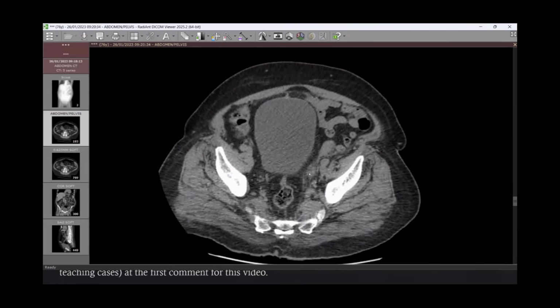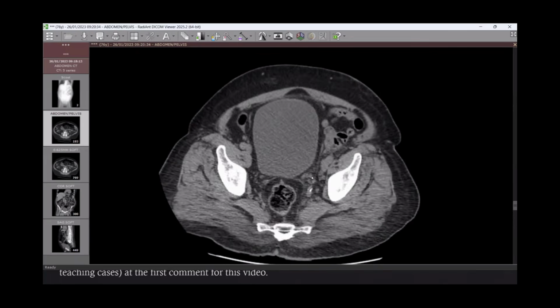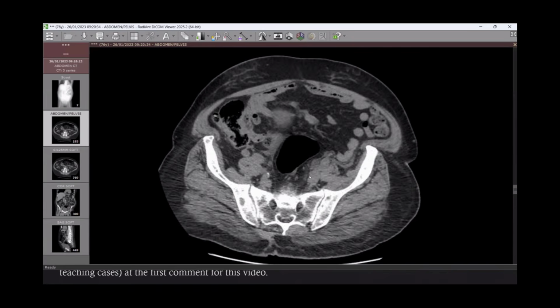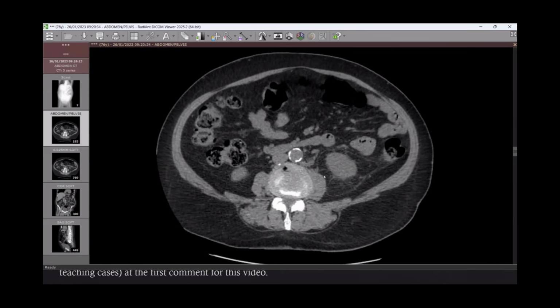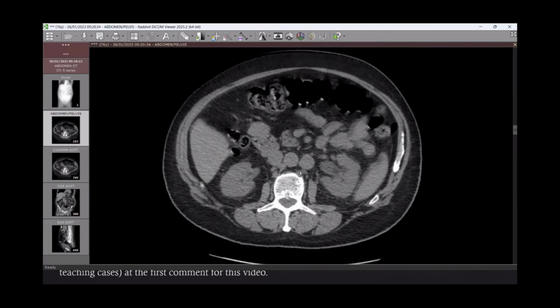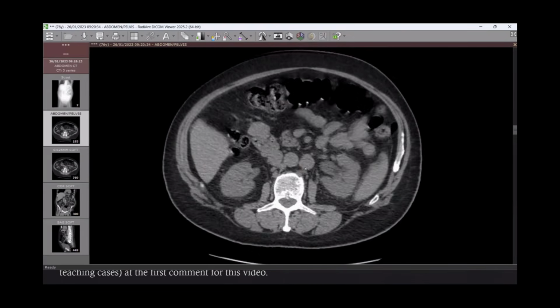And here we have a sudden discrepancy between the lower ureteric segment and the middle ureteric segment. This can represent ureteric stricture. We requested a post-contrast CT urography to evaluate this segment, but it was not done. We have multiple retroperitoneal lymphadenopathy, para-aortic.